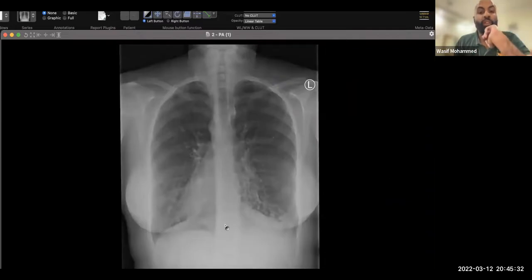So there is dextrocardia, there are bronchiectatic changes with peribronchial thickening. And then again, pertinent negatives: no air, no fluid, no other lung lesions. The bony skeleton appears unremarkable. There's no mediastinal lymphadenopathy. Just 3-4 clean pertinent negatives. Right, and then you bring in the clinical history.